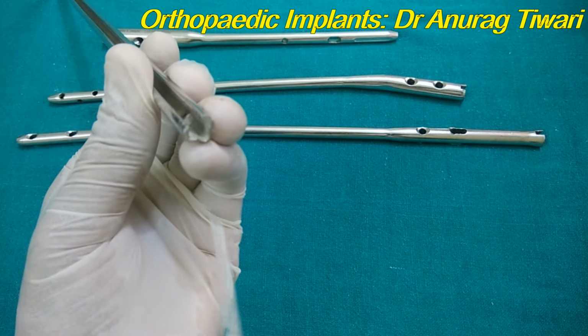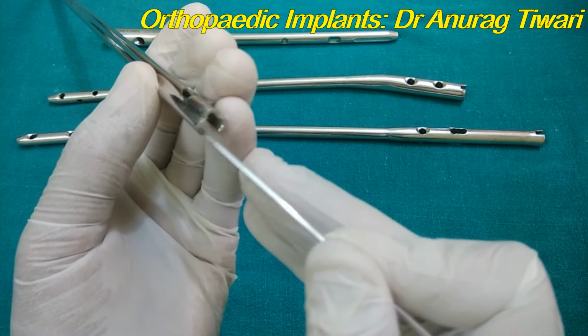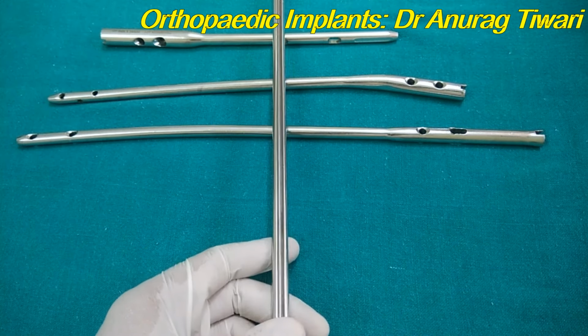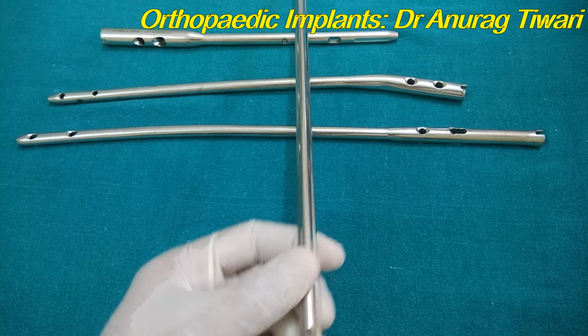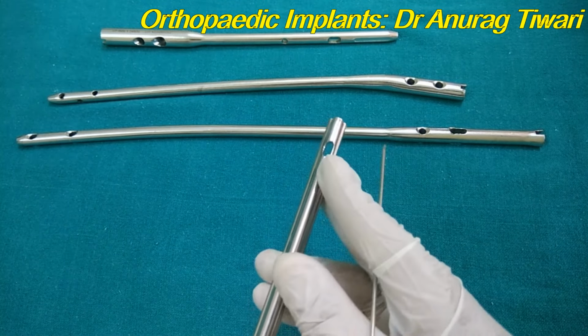The shape of the nail, or the cross section, is actually clover leaf shape. Now there is a plant which is clover, and it is not the clove, just remember it is a clover leaf. You can see here that this is the cross section, and this gives a fixation in the medullary canal, the slot, and opposite to the slot is the eye. You can see that this is the eye on one end and on the opposite end.